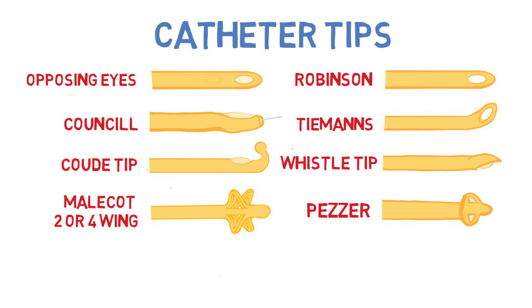The hematuria catheter is usually a large French and has an opening for irrigation as well as drainage. Some of them are reinforced with metal rings in order to help prevent further blockage.